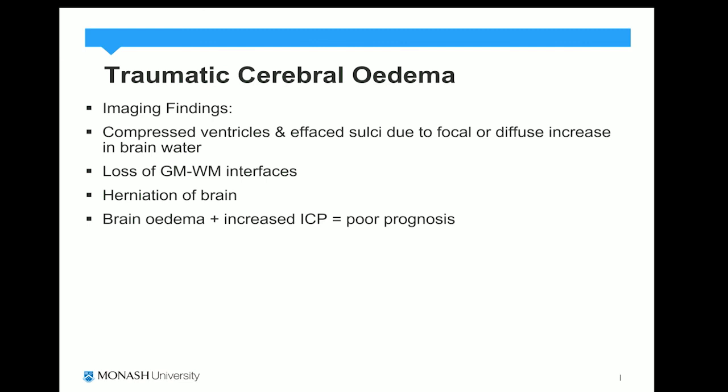Quite often with severe cerebral edema, there might not be a bleed. However, this patient will be in an unconscious state for a while, and then in the end the brain just becomes irretrievable, and quite often they have to make the very difficult decision to actually switch off the equipment that keeps the patient alive.